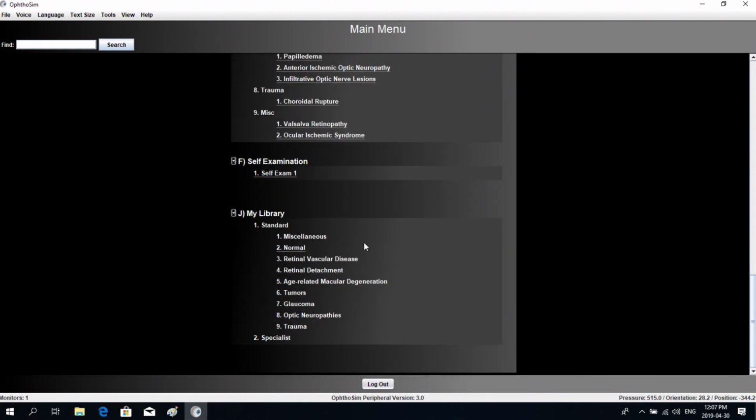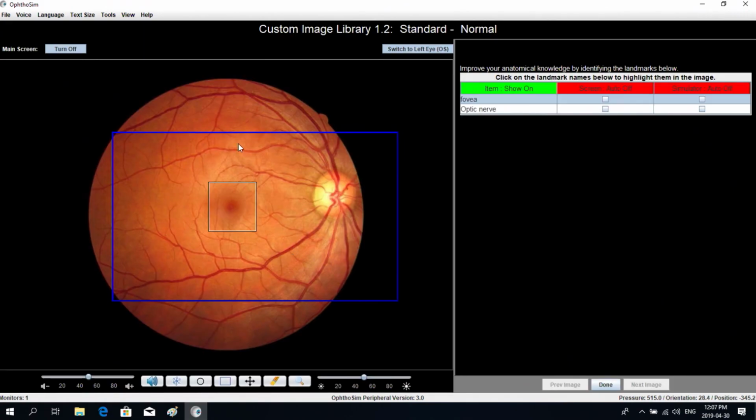For this particular example, we've put in only one image, so you can see that it'll outline where you have added content. You put contents into these categories as you use that particular software package on the Educator's Toolkit. In this case, this is a normal category, so then it gives you the image that you've imported.